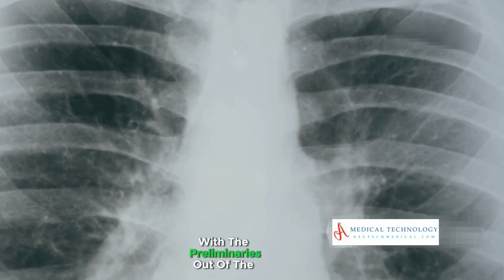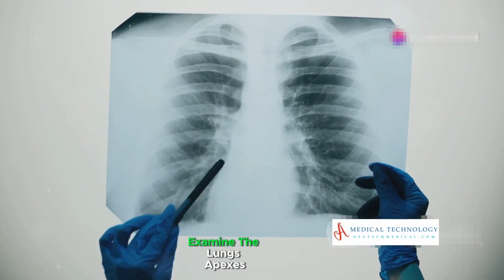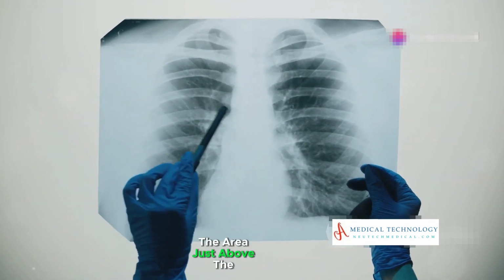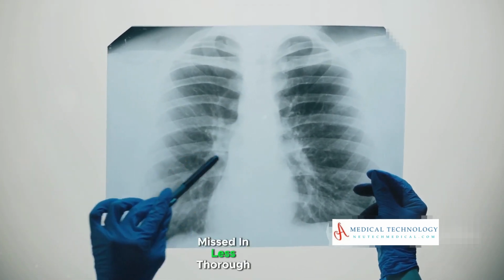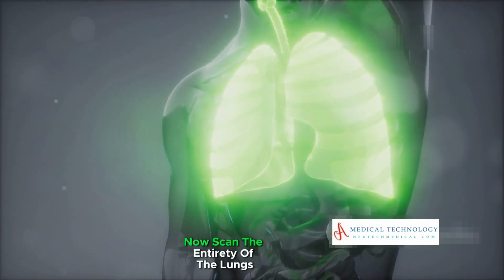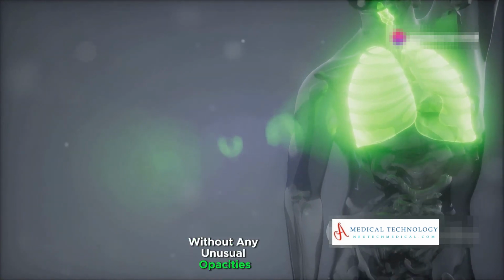With the preliminaries out of the way, dive into the anatomy. Start at the top. Examine the lungs' apexes, the area just above the collarbones. This region can sometimes harbor lesions missed in less thorough examinations. Now scan the entirety of the lungs. The lung fields should appear clear without any unusual opacities.